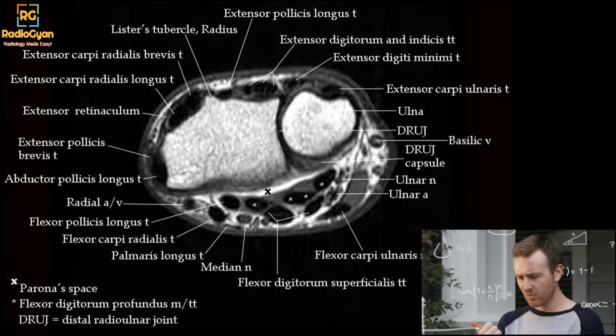So this is the typical MRI anatomy for the wrist, and this can get really confusing. When I see this anatomy, I get confused like this guy in this picture here. There are too many things to remember. It's a complex region. So we'll try to simplify each compartment, and see if we can come up with useful tips for remembering what goes in each compartment. Once we are clear with that, the pathology is easy in most cases.